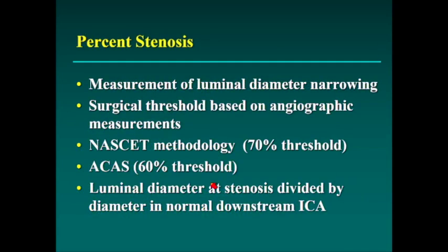And a couple more things to say about pitfalls, and that one would be abnormalities that come from measurements. The measurement of the luminal diameter will not be the same in grayscale, power, and color Doppler, and that's because of what they're doing at that edge of the vessel, and I'll get into that in a minute.